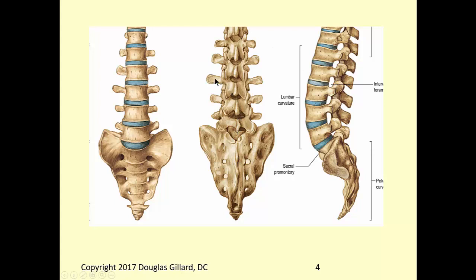Transverse process of L3, this thing right here. Superior articular process of L3, this one. Inferior articular process of L2, this space right here. Lamina, this. Spinous process of L5, L4, L3, L2. Get it? What's this hole right here? Interlaminar space. It's between the lamina. Okay, let's see. I think that's about all we need to see.